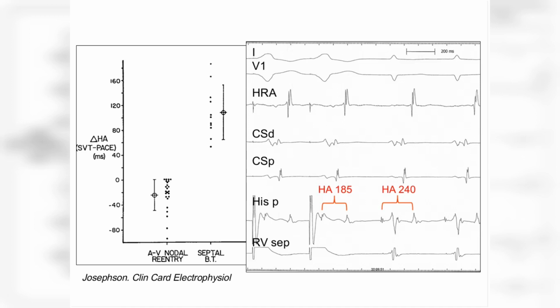We need a stimulation. So this is just to stress that point, because in this case, we can see how the activation is coming through the distal coronary sinus. But in all those cases that you stressed before, these maneuvers are really, really useful.